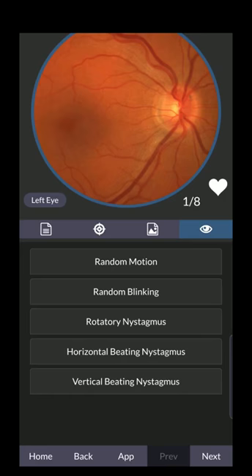And then you have, on the right, a bookmark in the shape of a heart. So if I want to bookmark this particular page and come back to see it, we can view it later. Or I can unbookmark it by pressing the button again. And the 1/8 is the progress in this particular section. So it tells me I've viewed 1 page out of 8 pages on this particular section.